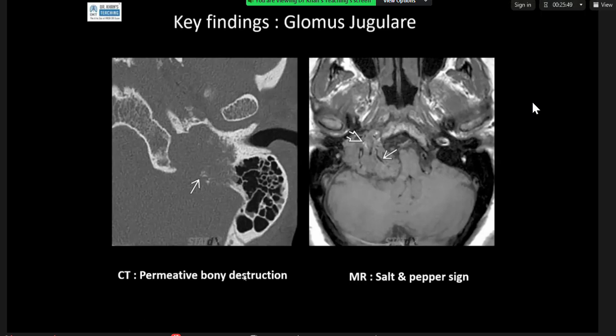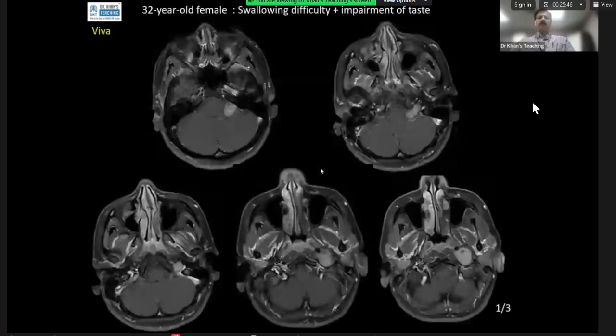Hi. Yeah. Okay. So this one is a mass in the same location. This is an MR scan. This is a fat saturated T1 weighted sequence. You can see something here, something here, something here, something here. Can you describe it? What is your differential?